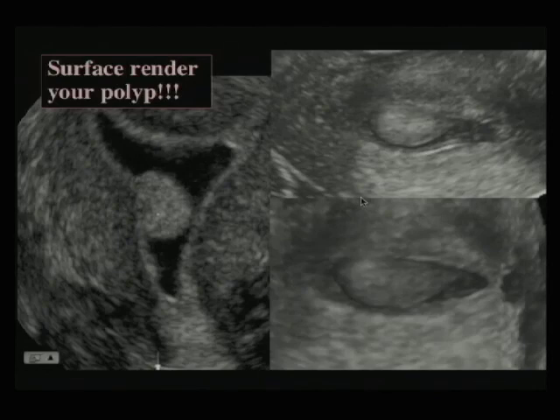You can render the surface of the polyp, and we haven't really talked too much about surface rendering, but surface rendering is another option when you have a volume. And if you have a fluid interface, like you do right here, you can render the surface of the polyp because that's within your volume. And so this is the standard coronal reconstructed plane showing you that triangular shaped cavity with the polyp in it.